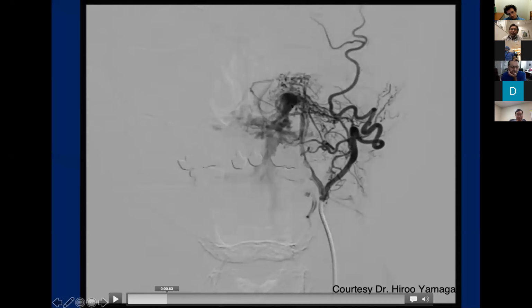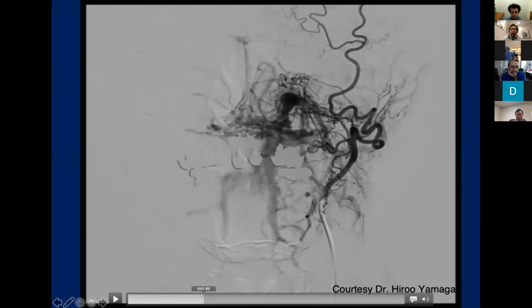Usually with these kinds of veins you don't get reflux into the IPS, and usually not into the posterior fossa veins. In this one you don't see the reflux into the IPS or anything, but there are some veins draining to the opposite side into the superior petrosal sinus, so it's bypassing the brainstem veins. So what's going on there?